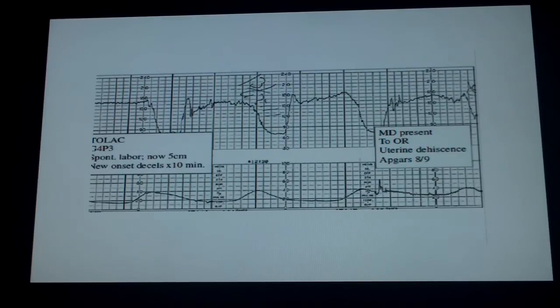A little bit deeper, but they are abrupt, and they do not last longer than 2 minutes. They look a little uglier, and they are late in timing, so we don't comment on that. That doesn't matter as much. There could be a little combination of things going on there.